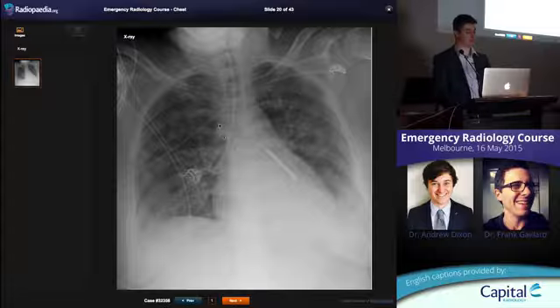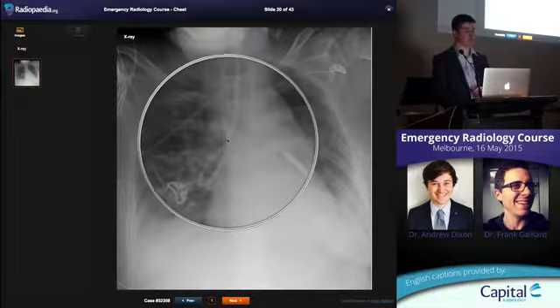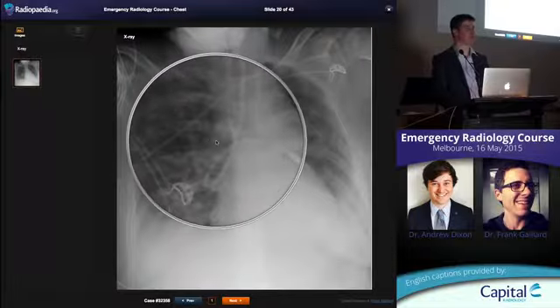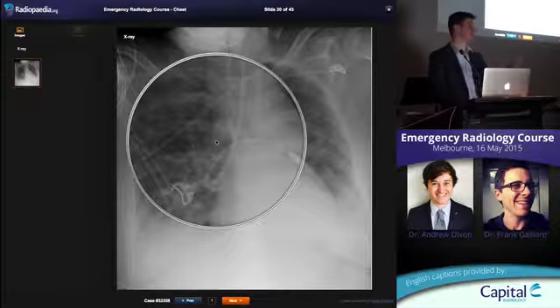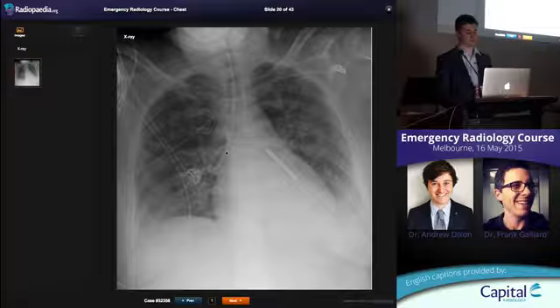The other thing that tells you there's positive or high venous pressure here is that azygous vein. See that thing sitting there sits right above the right main bronchus. Always sits there. It gets distended when you've got high venous pressure, it's a marker of a JVP, same as a JVP. Okay, so if the azygous vein's dilated, it's a sign of high pressure. This is a PICC line coming in from the right arm, sitting in the SVC.